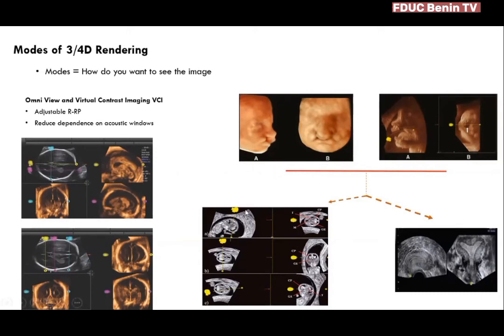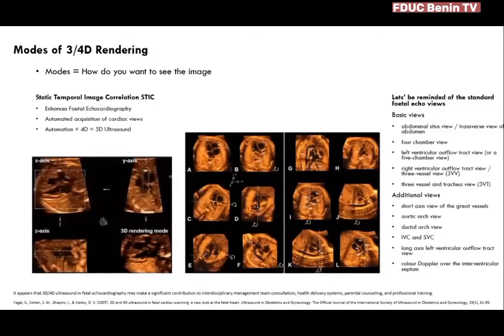And now this is also applicable in gynecology ultrasound, where on this image we have the uterus, but we've introduced the reference reconstruction plane here. It's curved, so it suggests that it's not always a straight line, and it can render for us the image of the endometrium so the observer can appreciate what's going on without the need for saline or any of those invasive maneuvers.